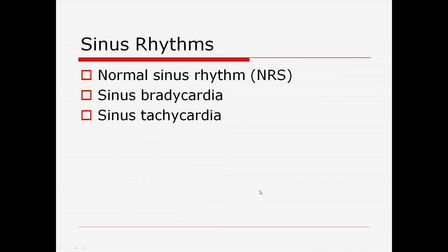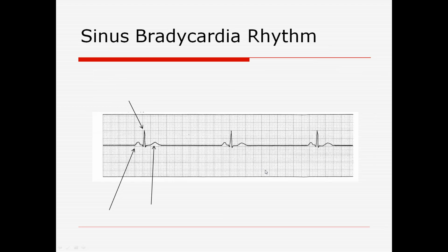So sinus rhythm, just to review, we have normal sinus rhythm. It could be sinus Brady or sinus tachycardia. So here's a sinus Brady rhythm.